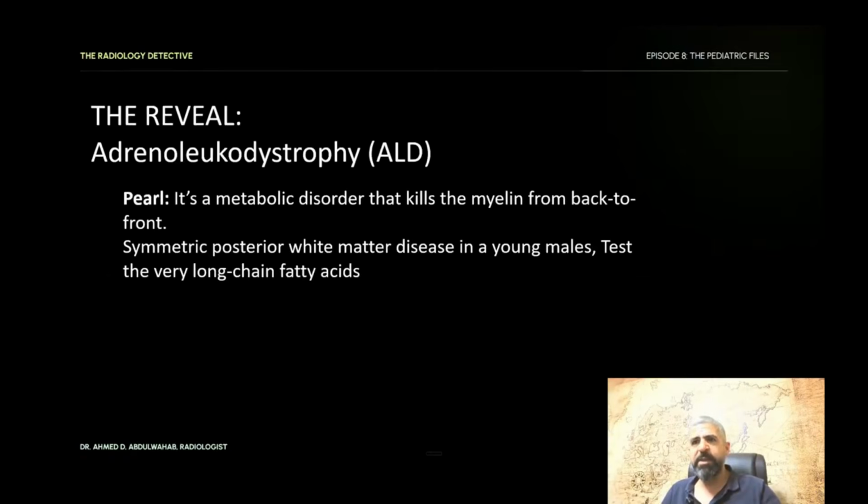The reveal, the suspect is adrenoleukodystrophy. This is an X-linked disease. Pearl, it's a metabolic disorder that kills the myelin from back to front. If you see symmetric posterior white matter disease in a young boy, adrenoleukodystrophy is your prime suspect.